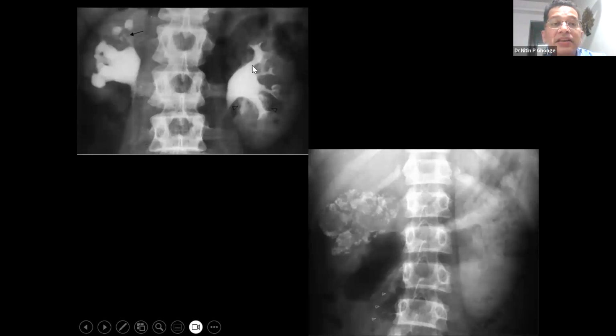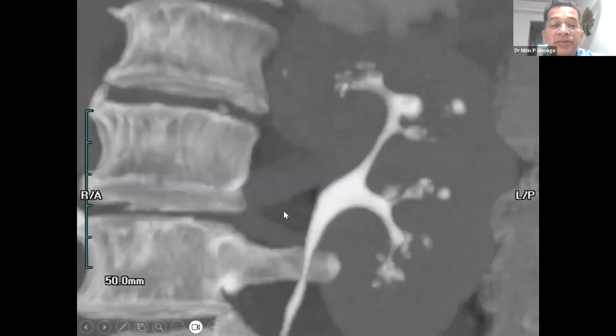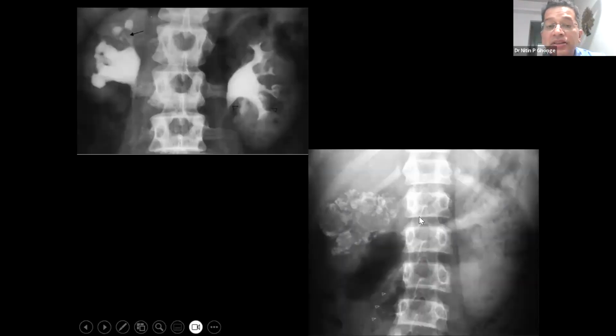At times you can see this is the normal infundibulum and major calyx, but here it is narrowing because of tubercular involvement of the calyx. Infundibular stricture is there, and there is proximal dilatation. With time, this leads to putty kidney or complete calcification of the kidney in late renal TB. So in a TB patient, the excretion of contrast is compromised and you see less density.